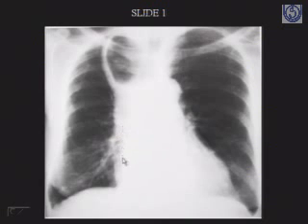Alright? But in this case, there is no cardiac pathology as such. Again, I told you, always look at all the structures which you can see on this film. You are seeing a widened mediastinum. Can you comment on the gastric bubble? Not clearly visualized in this case.